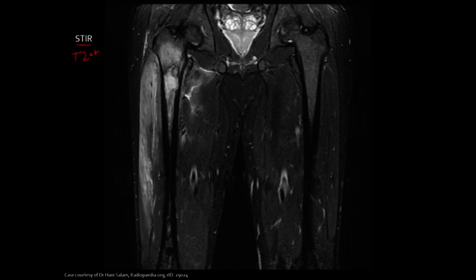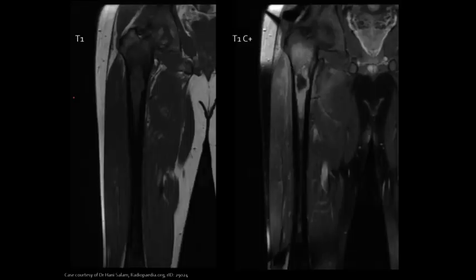So yeah, still going to be our destructive diagnoses. Because there's no real soft tissue mass growing out of the bone and we have more just inflammation, like that swelling, I do like osteomyelitis as a better diagnosis based on this MRI that we're looking at.